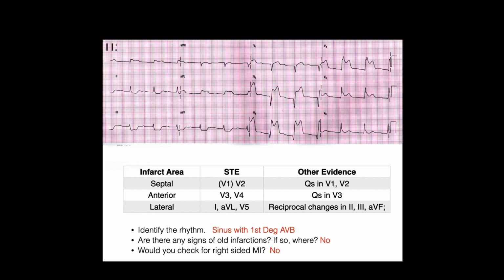So a good way to check that out is, again, look at all of the different leads. First of all, not always, but most of the time, T waves and U waves are both either upright or inverted. Okay? But also look at V1. So I think it's pretty fair to say, nah, it's a little bit too far off to think of a U wave. So it makes more sense it's a P wave.